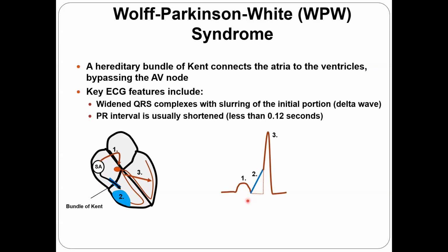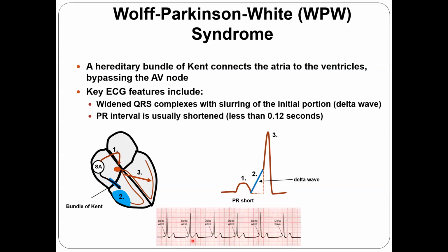And the first part of the QRS looks like a delta wave, as you do have. So this is the sign of the WPW syndrome. Similar, simple one: PR is short, and we do have a wide QRS. PR is short, wide QRS, WPW syndrome.